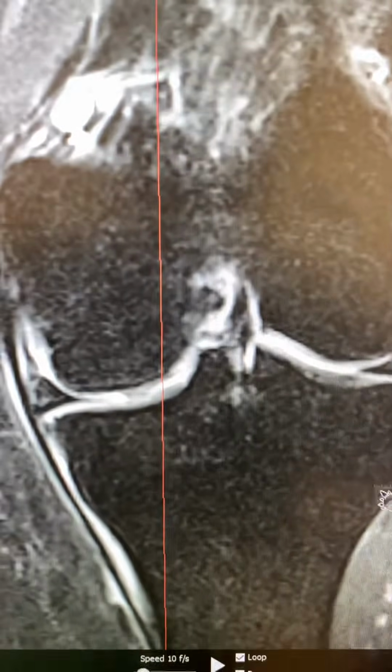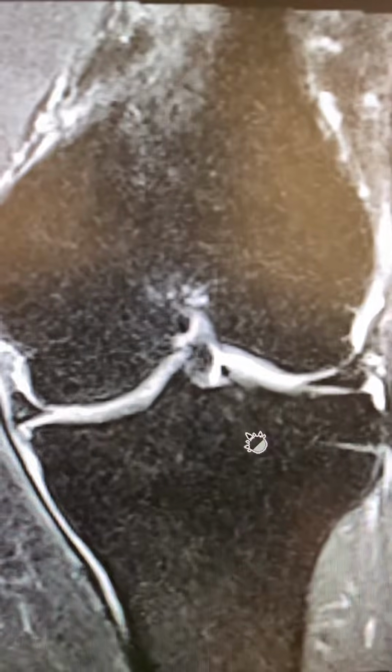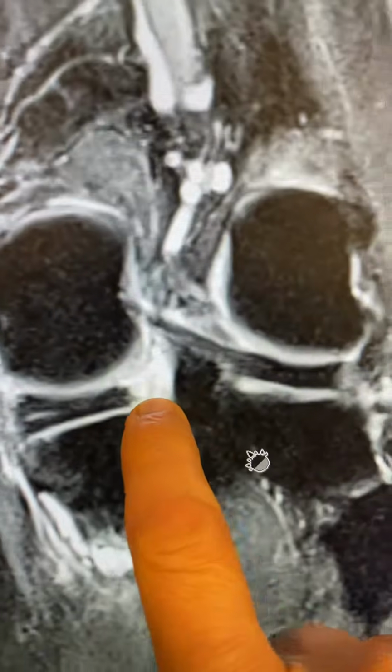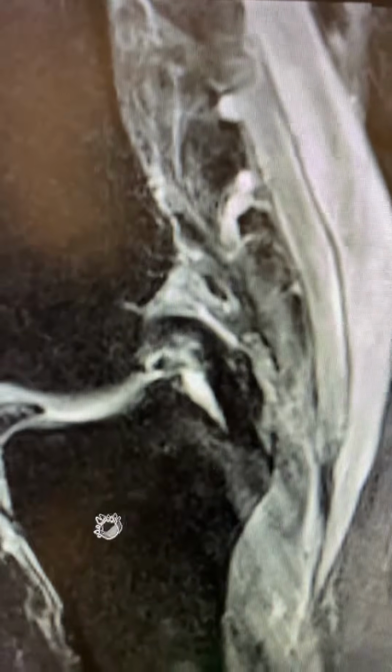So once again, here it is, MRI, frontal view, also known as the coronal images. Go to the back and look for the gap. Sagittal view, find the PCL, 2 clicks medially, 1, 2, you should have a meniscus there, and if you don't, you've been ghosted.